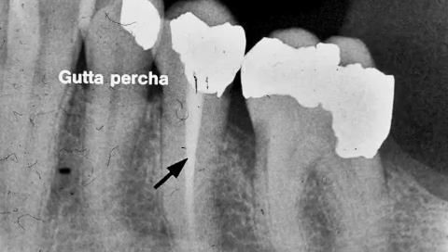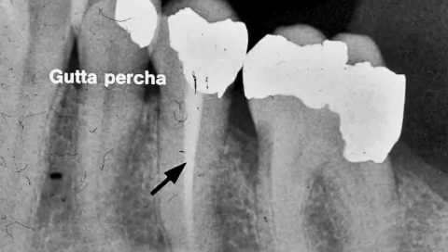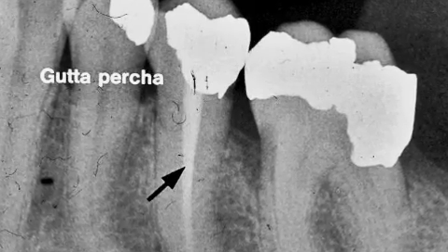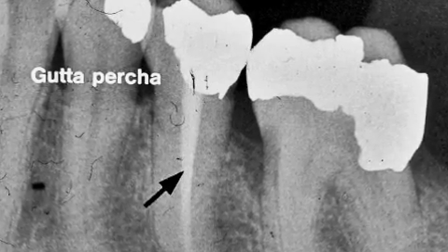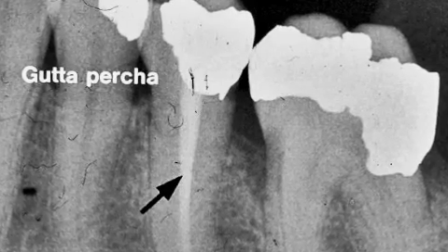Gutta percha is a radio-opaque filling material that's used for root canal fillings. It comes from the latex tree. People with latex allergies, though, do not have difficulty with gutta percha in the root canal, as it is sealed with a restoration. Gutta percha is a very old material that has been around probably for over 100 years.